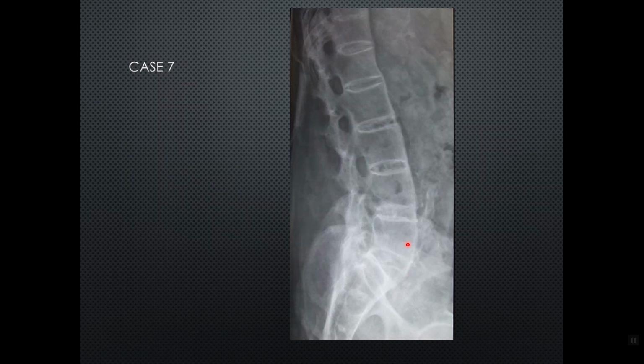Of course, you're going to see some changes in the sacroiliac joints. On normal imaging, you'll certainly have that. But typically, just to demonstrate for learning purposes, this evidence of marginal syndesmophyte bridging, end plate to end plate without any skip areas, that's highly indicative of ankylosing spondylitis.